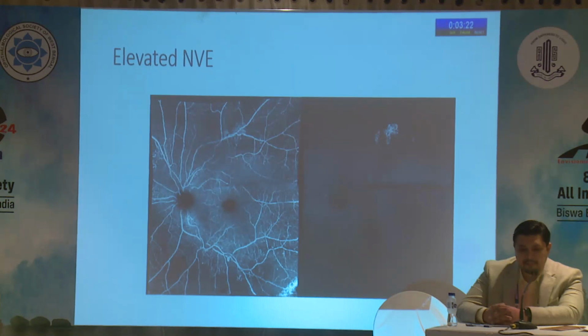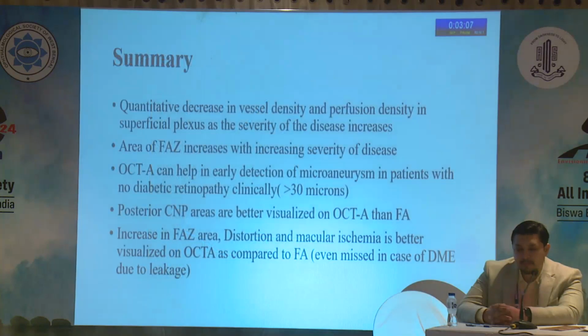One advantage with OCTA is that you can segment at the level of ILM and you can see these NVs are actually raised and projecting into the vitreous. That is one advantage of OCTA. It tells you which NVs are raised and which are flat on the retinal surface.